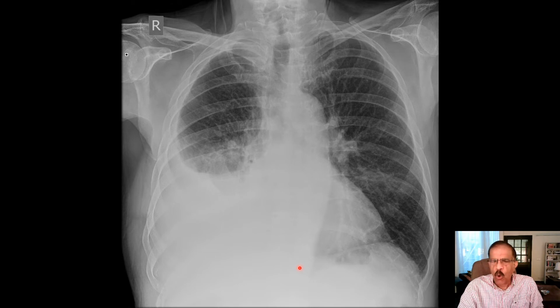Now, what is the cause of this pleural effusion? Perhaps some inflammatory or malignant condition, because in those conditions which have transudate, like cardiac failure, nephrotic syndrome, cirrhosis, you normally see bilateral pleural effusion. In that case, you may also see a small right-sided pleural effusion, but if it is large, then it is perhaps some inflammatory condition or maybe malignant condition. So this is, I think, the commonest appearance of pleural effusion on X-ray.